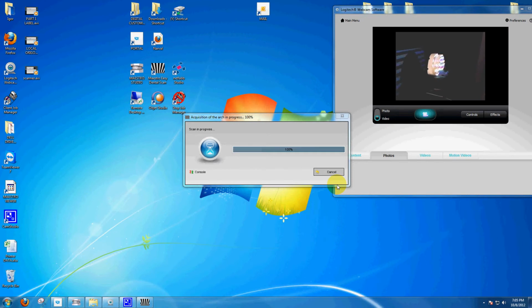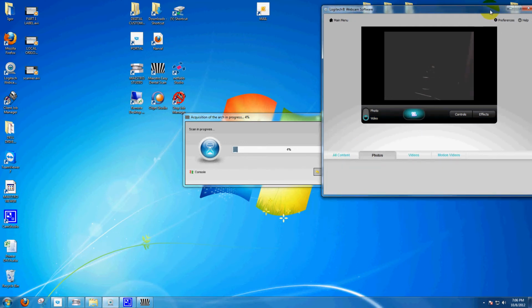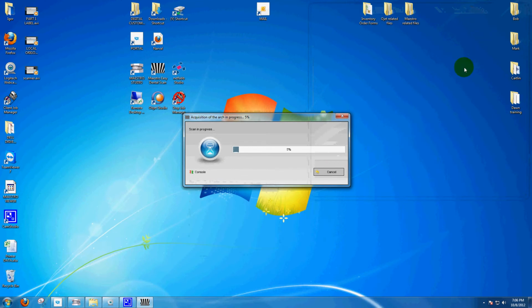Now the table is not turning. The cameras are just getting one parting shot into the difficult to see areas. And hopefully all of the detail will be captured between the 8 ordinary acquisitions and a supplementary one. So once again, a little bit of post-processing is taking place, and now I can remove the model from the scanner. The scanning is done, and I'm going to turn off the camera for now.